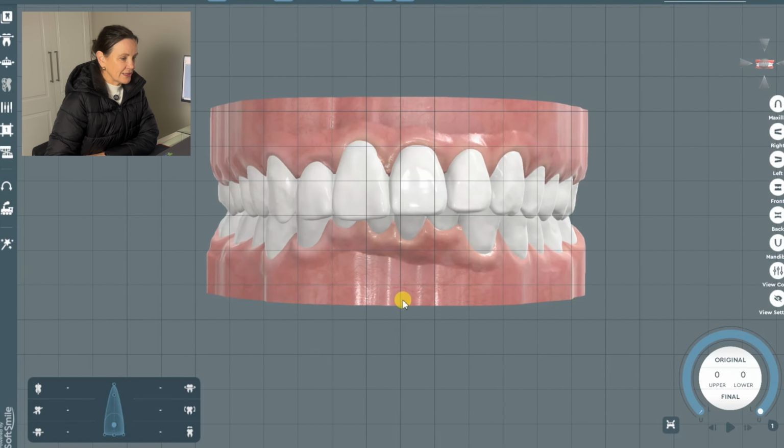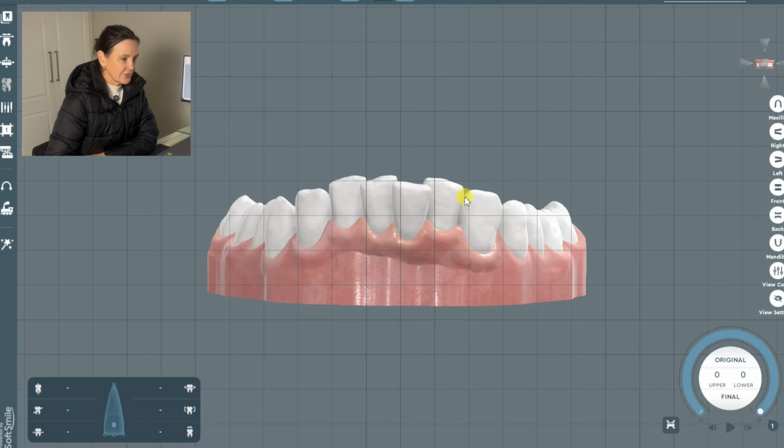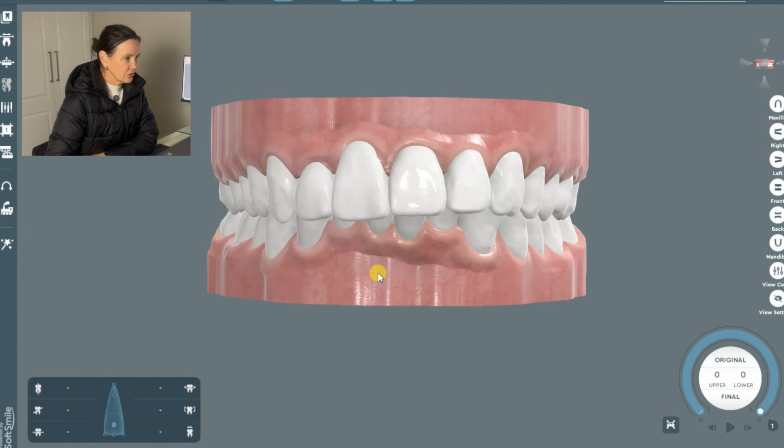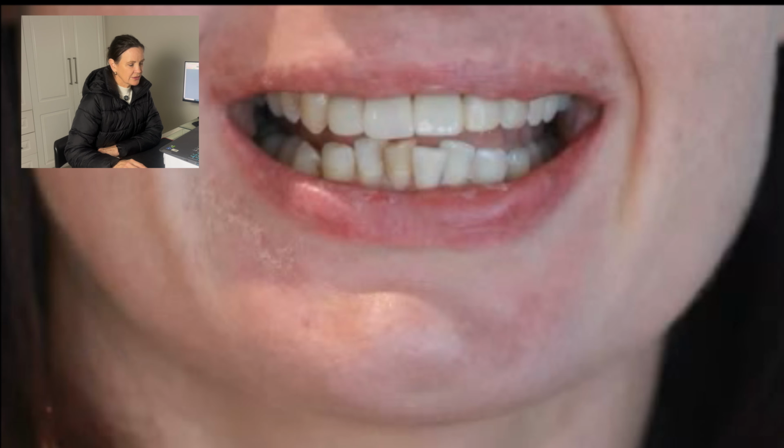The patient's complaint is the crowding of the mandibular incisors. She loves the upper teeth, and maybe I should take you through the clinical records. Looking at this picture, a beautiful woman, upper teeth beautiful. For us, looking at it, there is a visible cant with the right-hand side lower than the upper left-hand side. She's not even aware of that, and I'm not going to bring it to her attention.